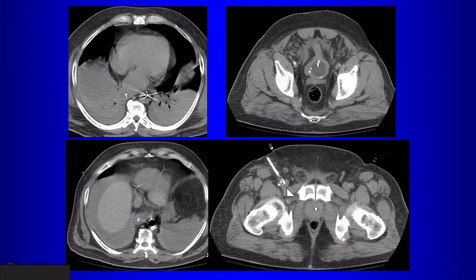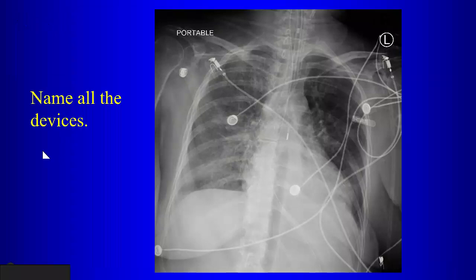It goes in through the femoral artery. When it's expanded with CO2, if you happen to catch it when it's expanded, there's gas in the pump, and it looks like air in the aorta. On chest radiographs, you can also catch them when they're expanded sometimes. So here's the tip, and here's the balloon pump full of CO2, so it looks lucent on the chest radiograph. That's an intra-aortic balloon pump.